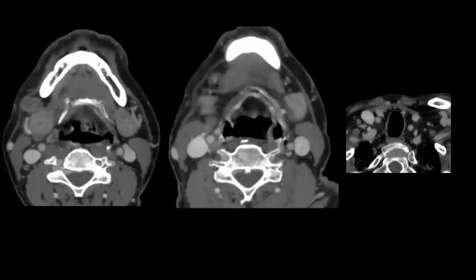Just for completion, I'll show you how metastatic nodes can be seen on CT. I will not talk about the levels because that will become very extensive. So this was a right buccal mucosa lesion, and we can see this rounded structure with non-enhancing central areas, following the regions where we expect to see lymph nodes. This is also abutting the platysma. In fact, this patient also had extranodal extension. This is the submandibular gland. So this is a right 1B metastatic lymph node.